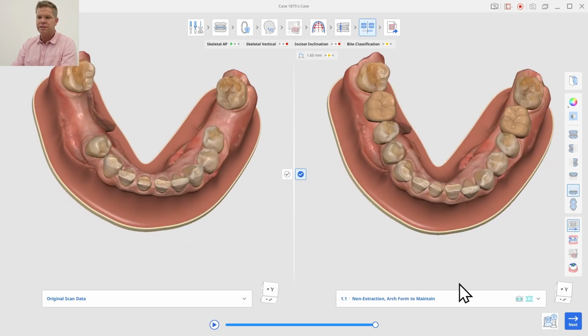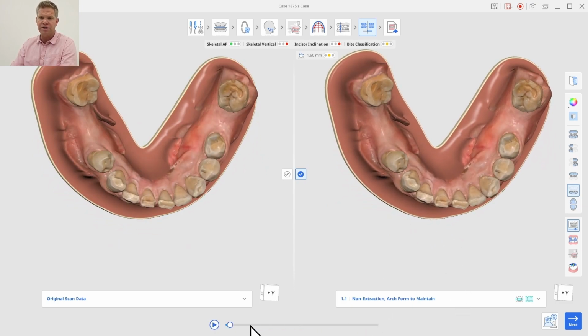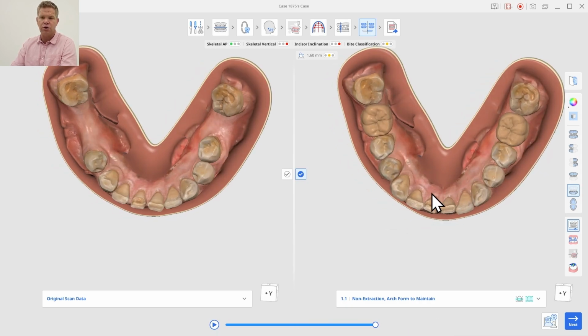So when we look at this case from an orthodontic perspective, if I place the implants in the obvious places in the 6 and the 5, I'm going to have a very hard time correcting that overjet problem. If I place those implants and the patient came back wanting to fix his overjet, you've really limited your treatment options because you've placed those implants that can't be moved. So this doctor started looking for other options to work with.